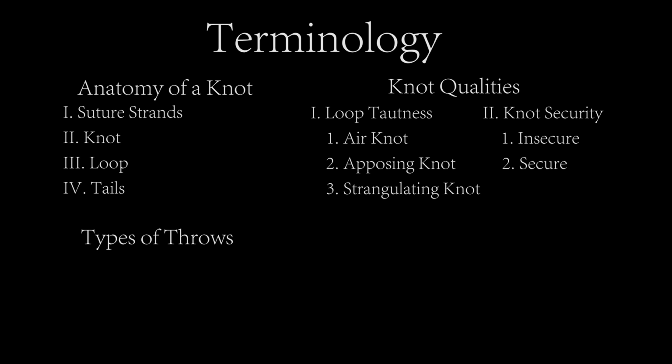Next, we will define throws and discuss different types of throws. We will define a throw as the act of wrapping one strand of suture around the other strand, and then passing the former strand through the resultant loop. Throws are the building blocks of knots.